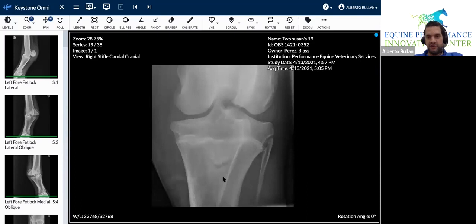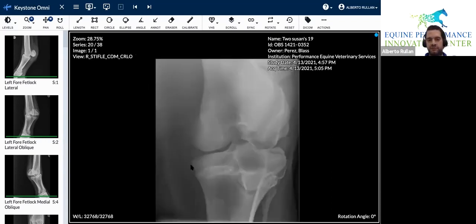This is the other stifle. So you do the same thing. You follow lateral femoral condyle, medial femoral condyle, lateral femoral condyle, proximal lateral tibia, tibial eminence, right? Medial eminence, lateral, where the cruciates attach. You go down. Sometimes you see a cyst over here, not to be confused with just benign lucencies, okay? Then you're going to come all the way over here on the medial tibia. Boom, you're done with the stifle.